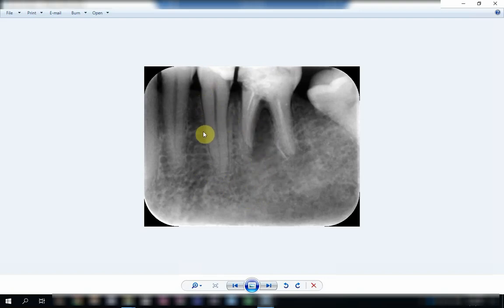We agreed that the lamina dura sometimes disappears, so it is not our reference. If it is present, okay, we can follow it. If it is not present, then we follow the structure that will not disappear, and this is the PDL. You start following the PDL from the crest of the bone, and then you go down, down, and you see that the PDL continues as follows exactly the course of the root, wherever it goes, whether it is dilacerated or straight.